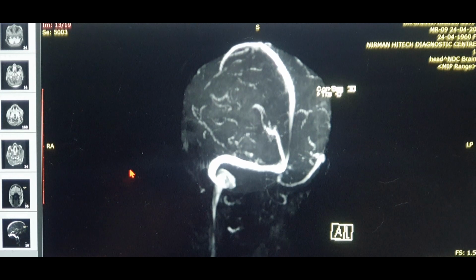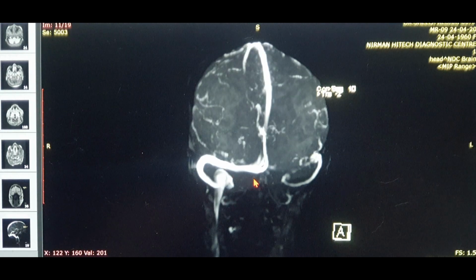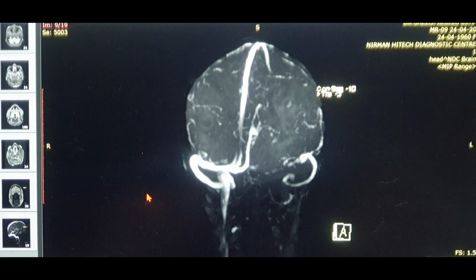recurrence of the CSF leaks where everything else is normal, but when the patient's MR venogram is done, then you can see one of the dural venous sinuses is kind of obstructed or having a chronic obstruction, for which the absorption of the CSF gets hampered, and that leads to the excess CSF. So the decreased absorption will lead to an excess amount of CSF. So that will lead to constant CSF leak somehow because of excess pressure.